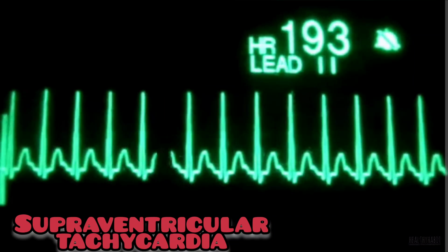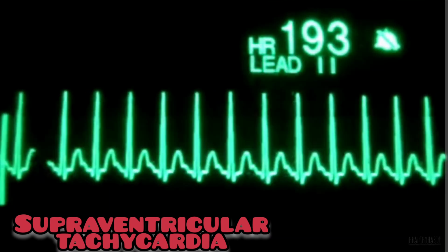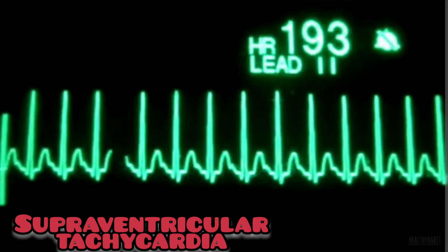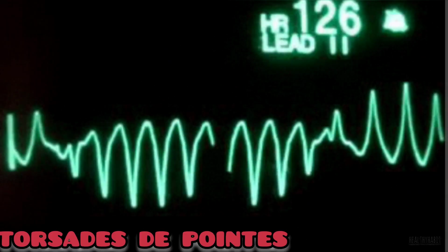Supraventricular tachycardia, SVT, is an irregularly fast or erratic heartbeat, an arrhythmia, that affects the heart's upper chambers. SVT is also called paroxysmal supraventricular tachycardia.